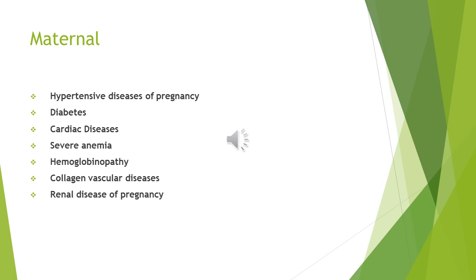So if we start with the indications of CTG, we need to know why CTG is started in the first place, because this will affect our management. Definitely, a CTG started because of abnormal fetal heart rate during intermittent auscultation in a low-risk pregnancy is completely different from a CTG started because of an IUGR baby.